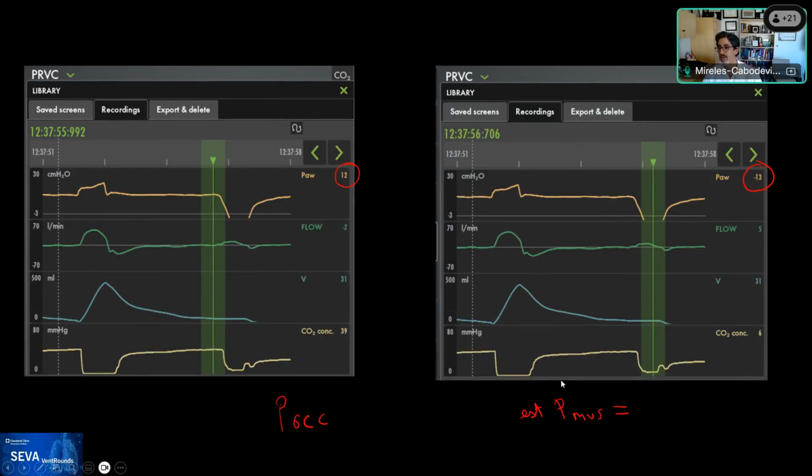Have no fear. There. All right. So Alicia already went all the way to the PMUS, and she said 18.75. And did anybody measure the POC and have a value? There you go, Fernando. But actually, it's a negative number. It's minus 25, Fernando. That's the important item here. Yes, thank you for putting minus.